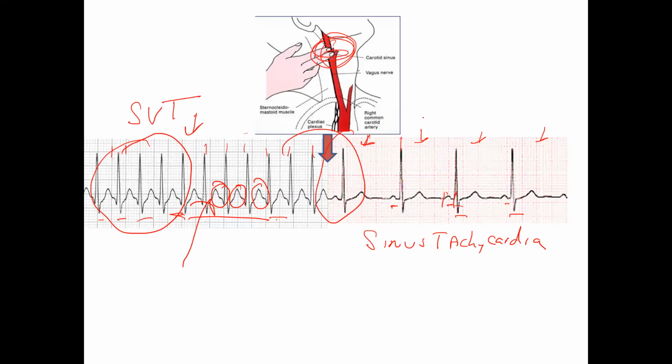If there was no P wave between these, like say it looked like this, QRS, and then another QRS, another QRS, chances are this is going to be a junctional rhythm, like junctional tachycardia or accelerated junctional rhythm, because junctional means the AV node is starting the cadence, not the SA node. So you have to have a P wave that's sexy in order to call the sinus rhythm. Whether it's tachycardia, bradycardia, or arrhythmia, the P wave has to be there and has to be sexy. And the P wave has to be followed by a normal PR interval and a normal QRS. I can't stress that enough.